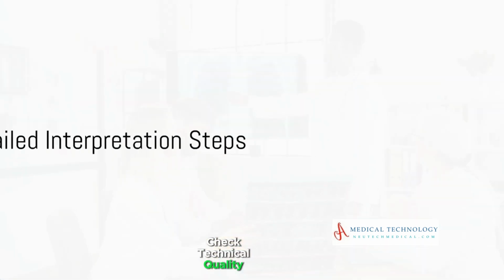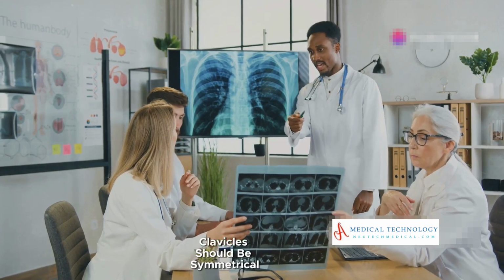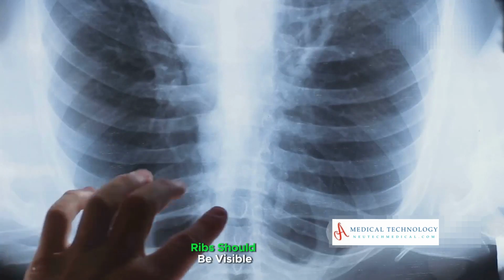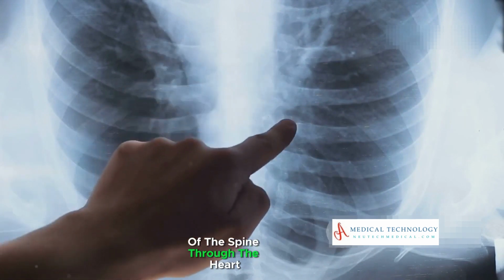Check technical quality. Positioning: ensure the patient is centered with no rotation. Clavicles should be symmetrical. Inspiration: adequate lung inflation is important. Typically 9-10 posterior ribs should be visible. Exposure: proper exposure should allow visibility of the spine through the heart.